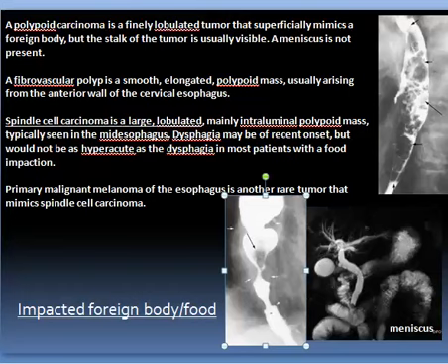This is a gathering of how a foreign body can occur and how it can be mistaken for a polyp or for carcinoma, and how a stone should be differentiated by the meniscus sign. Multiple fluid levels within the esophagus could be due to foreign bodies, as we said, or due to lobulated carcinoma.